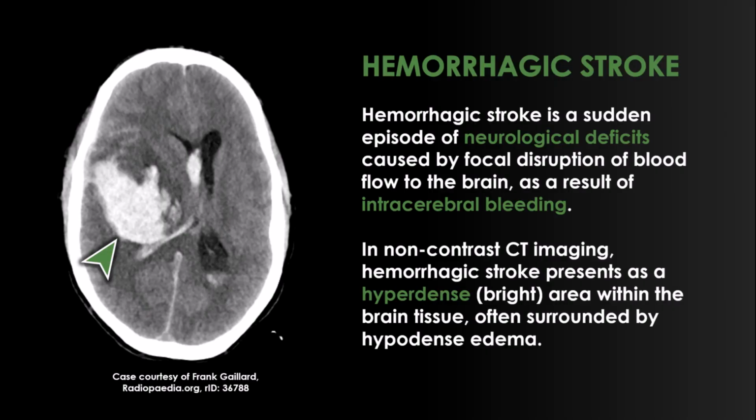The process of bleeding is called a hemorrhage, and the collection of blood itself is called a hematoma. Notice that this hematoma is large enough it's causing a midline shift. The brain matter on the right side is swelling and crossing onto the left side of the cranium.